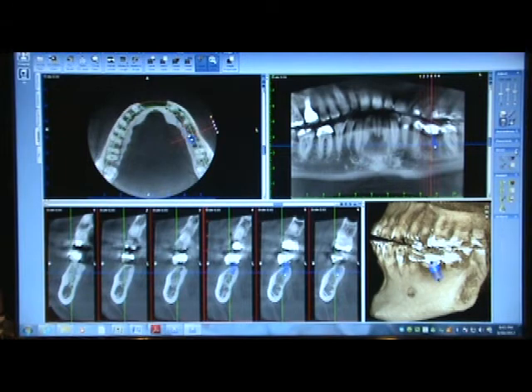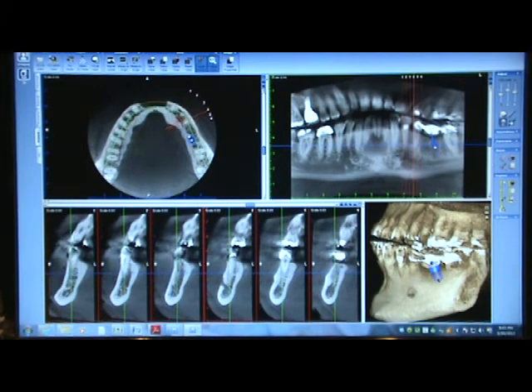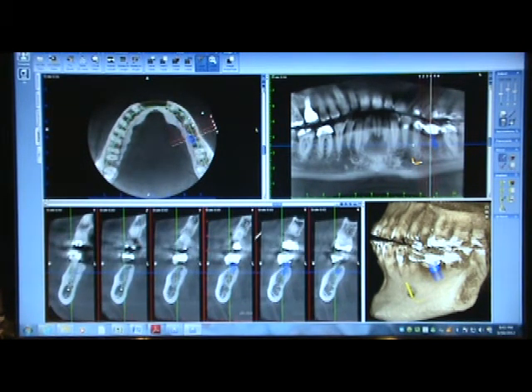Go down to your nerve tab. Let's go down to our toggle switch here, and let's bring that down to the front of where the mandibular nerve is. Now click the nerve pencil. I like to start outside the mental foramen and click, and you can follow it along. Just bring back our cross section. You can see the mandibular nerve.